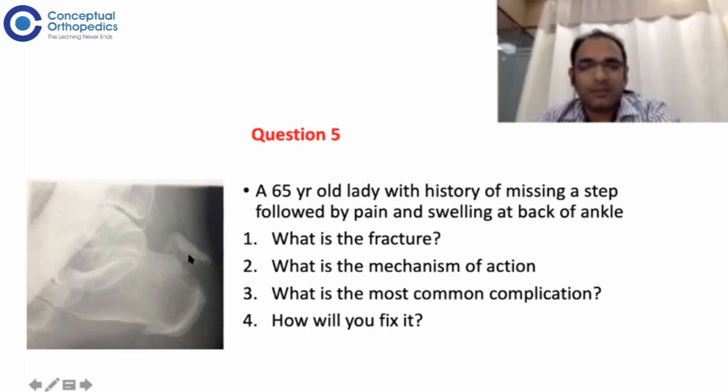when we see these fractures, this area can impinge on the skin at the back. And this is a relatively hypovascular zone with not a great blood supply. So the chances of it becoming open or of it having some soft tissue complications is quite high.